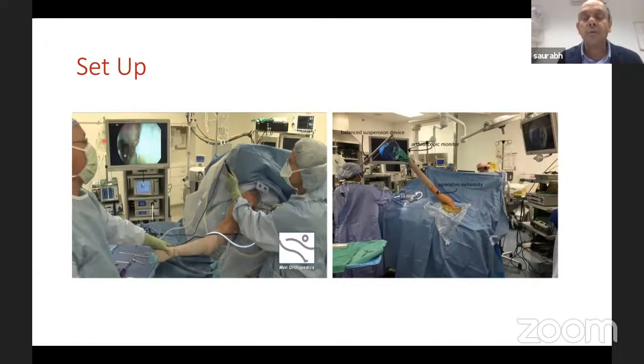Again, the beach chair advantage is familiarity, because we do arthroplasty work and most of the trauma work in beach chair position. So shoulder arthroscopy in a beach chair is sort of easy. Second, it's easy to convert it to an open procedure should the need arise. Third, there's almost no chance of damaging the nerve. Of course, the flip side is the circulation to the brain, because we as shoulder surgeons always ask our anesthetist for hypotensive anesthesia, which means the perfusion pressure to the brain may be less and there can be cerebrovascular ischemia and events.